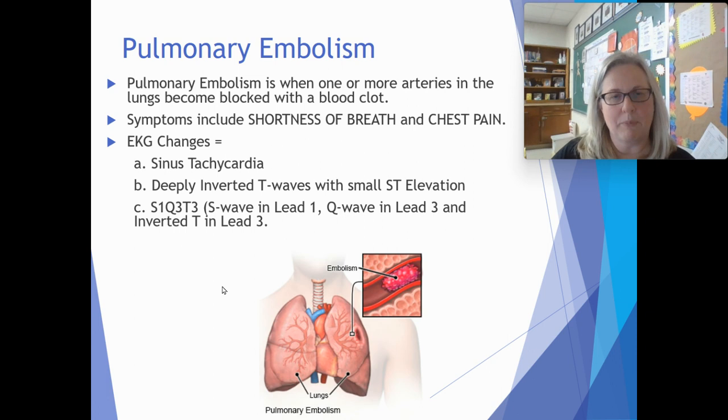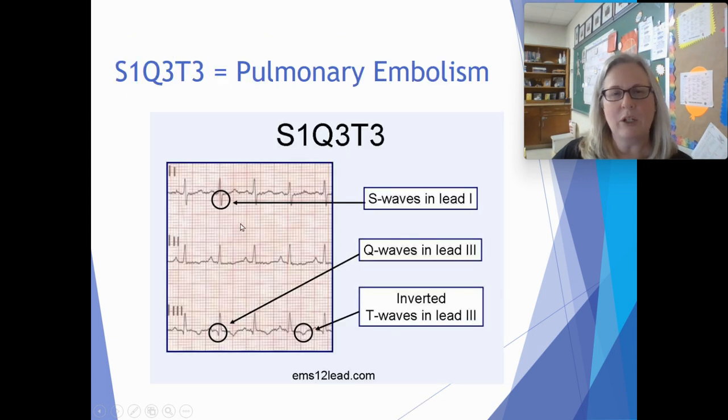Okay, so let's take a better look at it. We'll take a look at the EKG. Just write down this cute little thing that you're supposed to remember. That will help you when you look at it. All right, let's take a look. The S wave up here is going to be very prominent, very deep, a deep S wave in lead one.